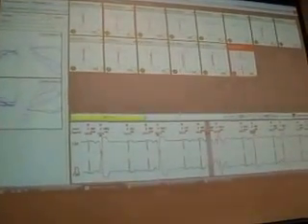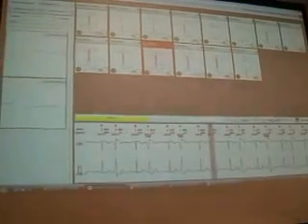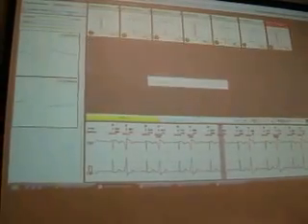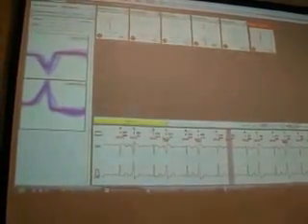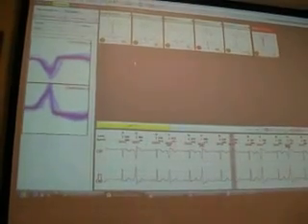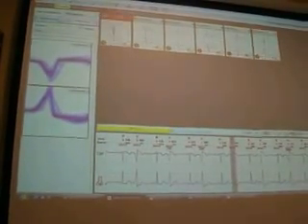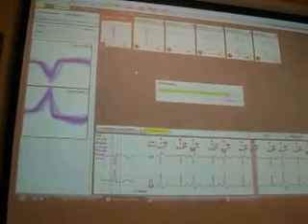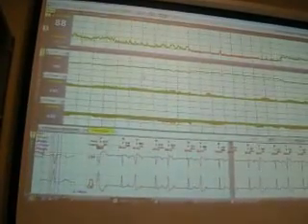And this is the last point. Update changes and auto merge. The software merged the similar clusters into one cluster. And I am ready with the template menu.